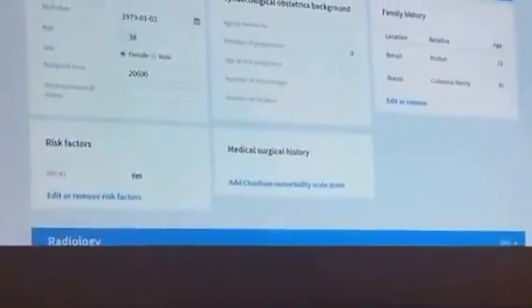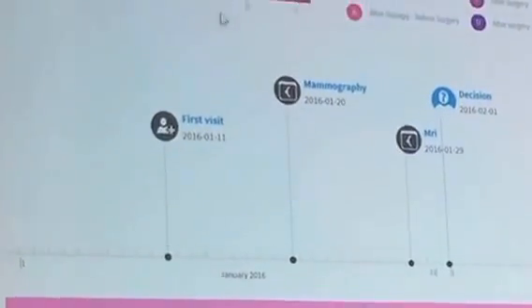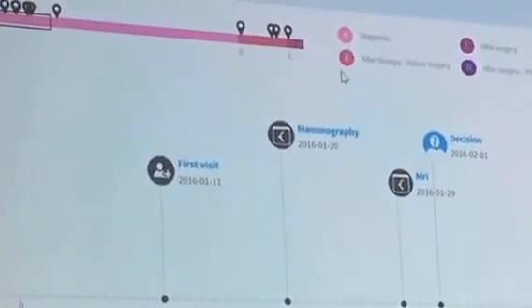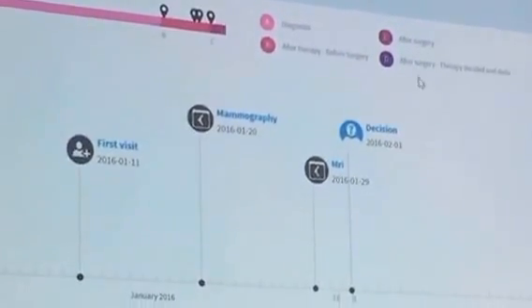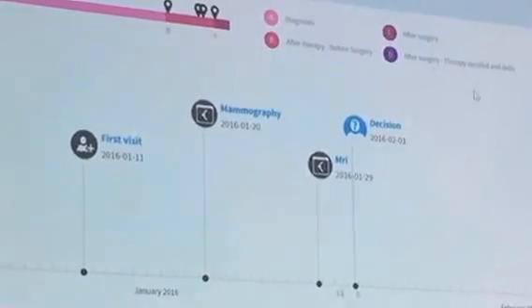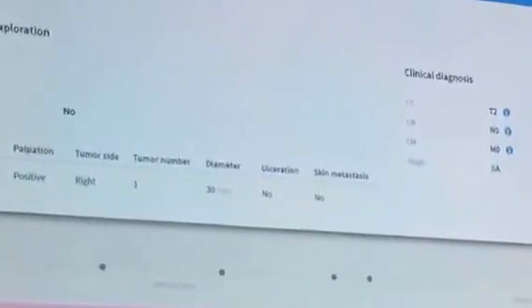And we can see also the evolution of that patient. So for patient 03, we see scenario A is for diagnosis, B is after therapy, if there was any therapy, then after surgery, and the follow-up. So after surgery and the continuation. So here we can see easily what the information of that patient was.